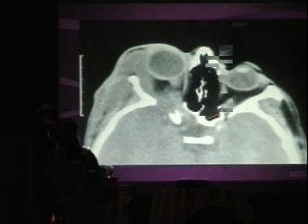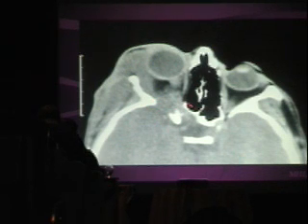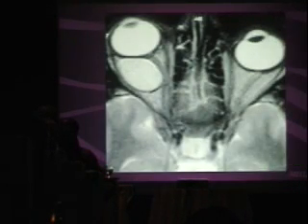Now, this looks like it could be a lymphangioma. It might be a lymphoma molding the orbit, but there's a clue here. There's sphenoid bone dysplasia, which actually makes this an Aunt Minnie in a child. So what is this? NF1. All right, that's a neurofibroma. In the same way that in the tibia or femur, you could get a long gracile bone. You know, you get sphenoid bone dysplasia when you have facial neurofibromas. Okay, so that's just something to memorize. That's an Aunt Minnie kind of appearance there. When you have the bony dysplasia.